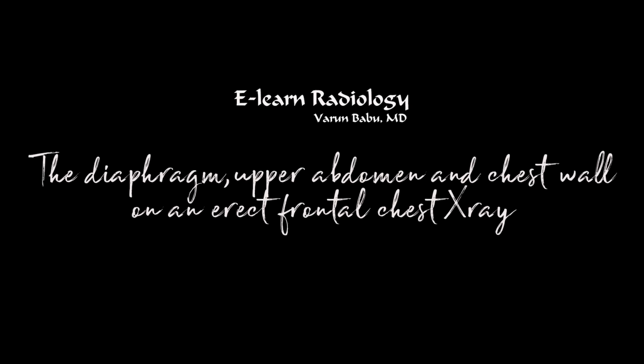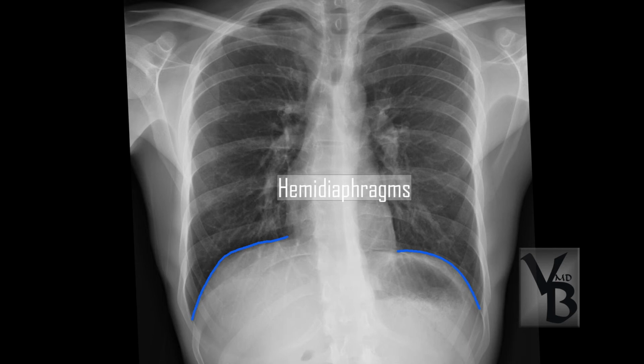In this final session of reading a normal chest X-ray, we will be looking at the diaphragm, the upper abdomen, and the chest wall. The hemidiaphragms on either side of the midline help separate the thoracic cavity from the abdominal cavity. The right hemidiaphragm tends to be higher than the left hemidiaphragm in over 90% of the patients. It is normally 1.5 to 2.5 centimeters higher than the left hemidiaphragm.